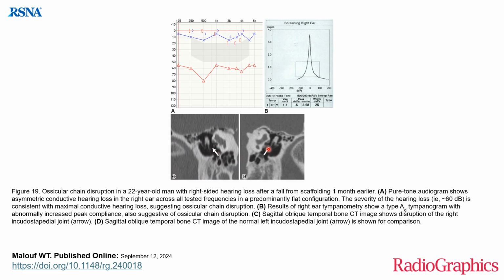And on the normal side, you can see there is a connection. There is no gap between the incus and the stapes.